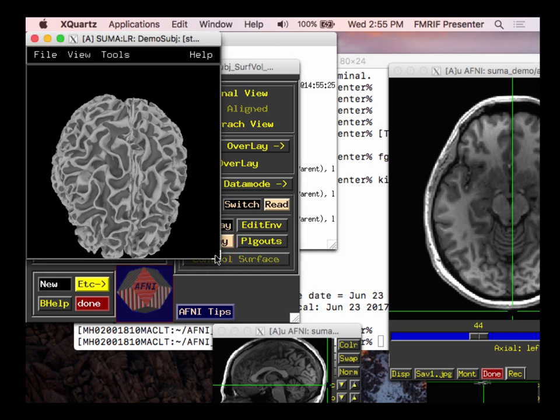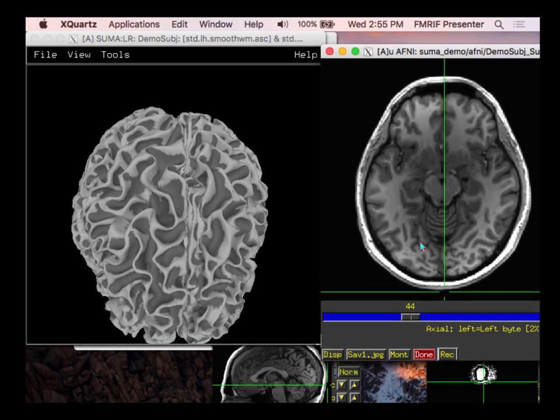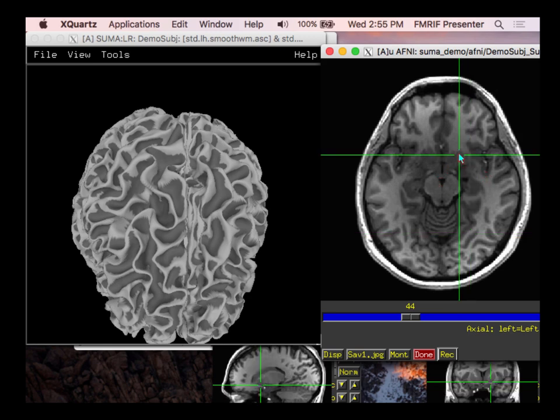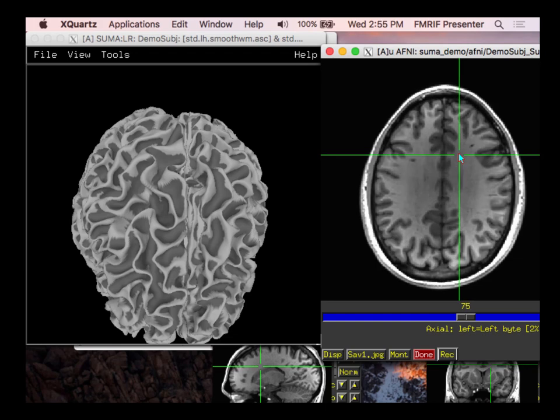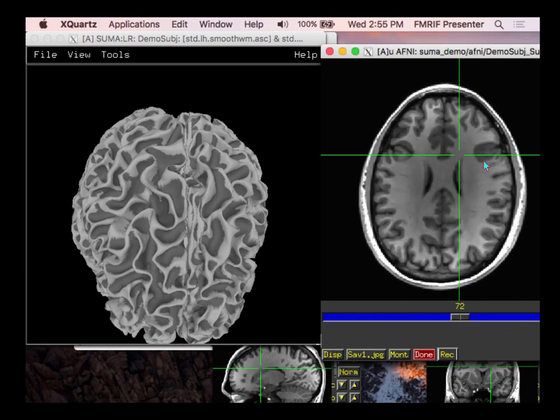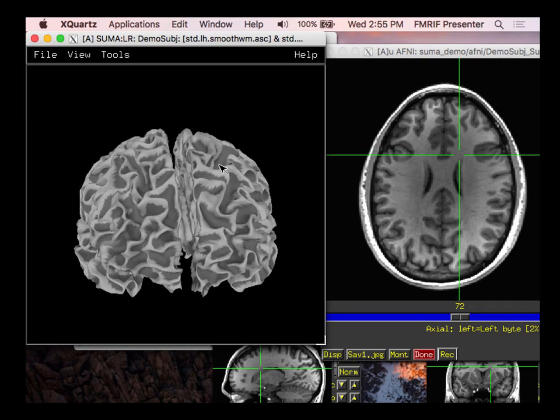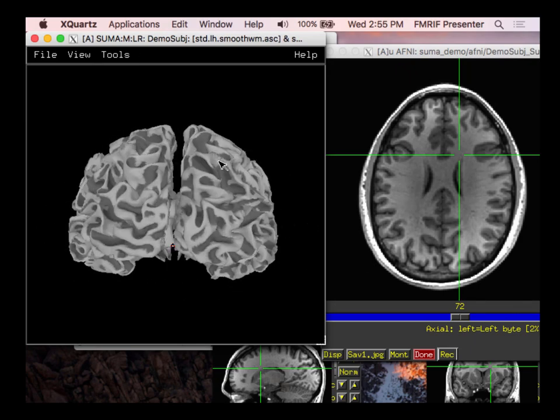Okay, so this is starting to look at a bit of SUMA on the left and AFNI on the right. And as you saw before, Bob showed briefly, this is an axial slice of the brain, and we can scroll around through it. You can see a little bit down here how I'm moving through it. So this is one representation that's nice. This is a nice three-dimensional object, and it has benefits that you can look all around it.